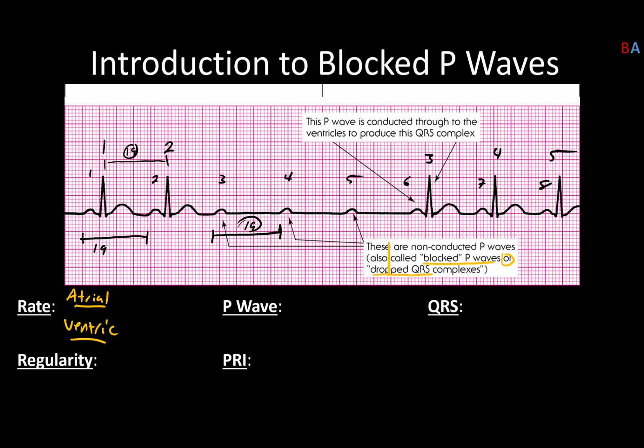We've got those in place, and so now we can do just a quick bit of math, and we can say that the atrial rate is 1500 divided by 19, which comes out to about 79, whereas your ventricular rate is, well, we have that large gap, and the ventricular is irregular, so I have to use 5 times 10 to get a rate of 50. Notably different, correct?